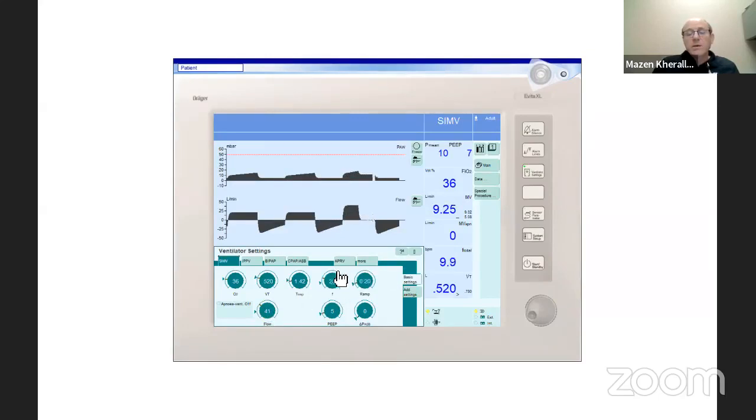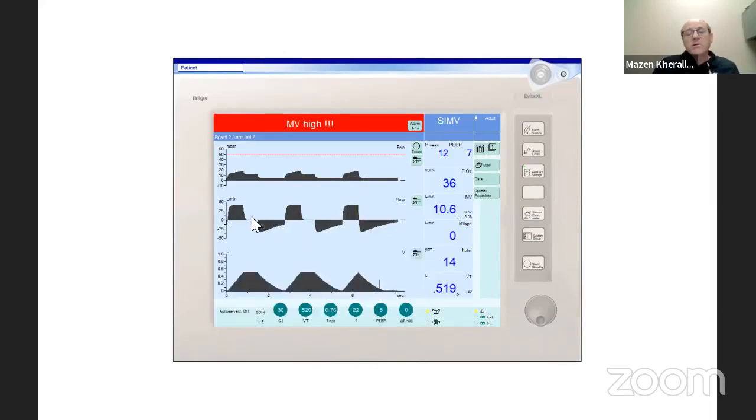Okay. And then see, we got some more, sorry, go down on the inspiratory time again. So we eliminated everything here. Now look at this, there's still a touch of dynamic hyperinflation. Decrease the rate a little bit or decrease the tidal volume and it is gone. Any other questions?